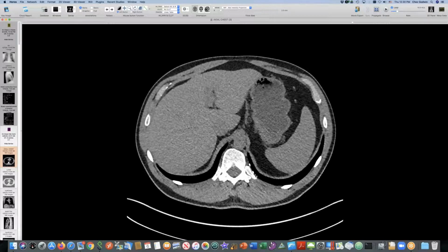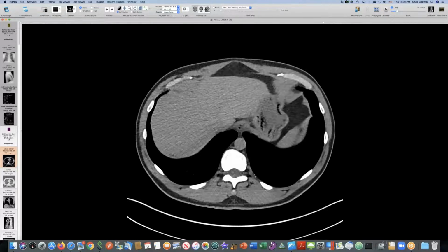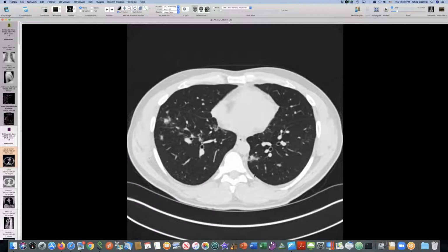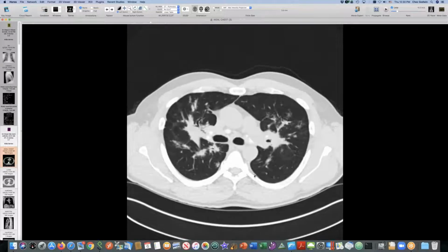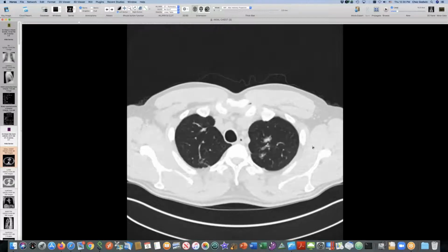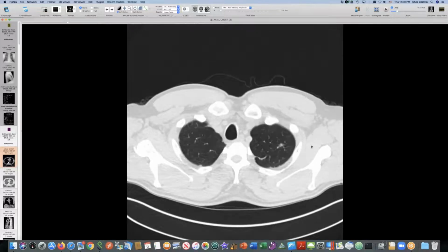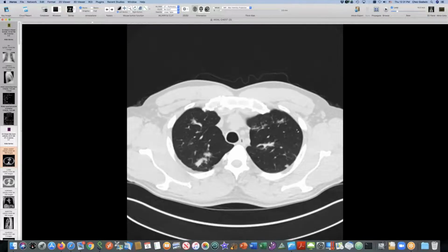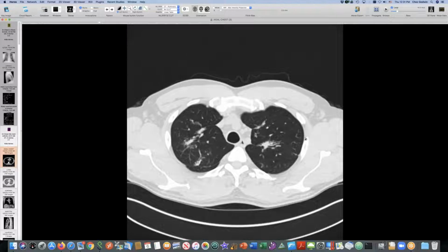Now, Remy-Jardin, Martine wrote an article about the year, I think 1990 in Radiology, about these subpleural opacities in silicosis or coal workers' pneumoconiosis and sarcoid, and in sometimes people who didn't have either of those, they were maybe just cigarette smokers. And she had some specimen radiographs where they'd inflated lungs and sectioned them and done radiographs of sections and things like that, and she showed quite a bit of stuff here.